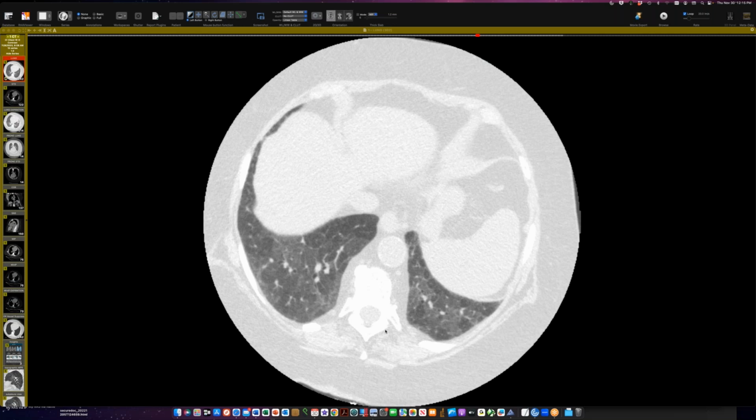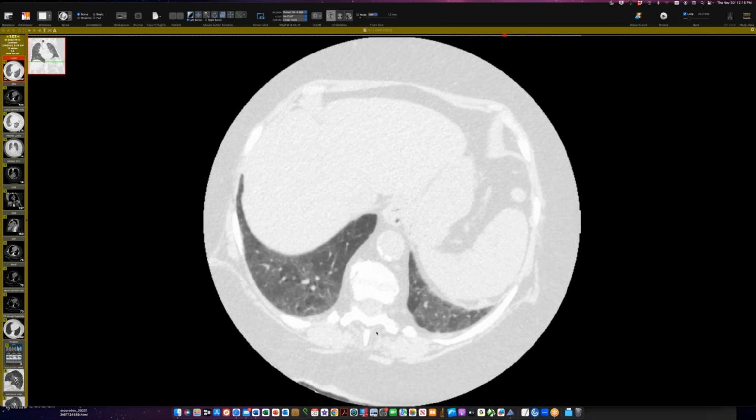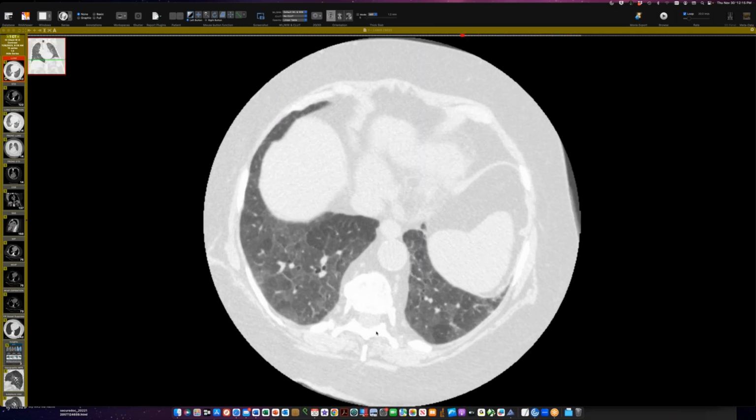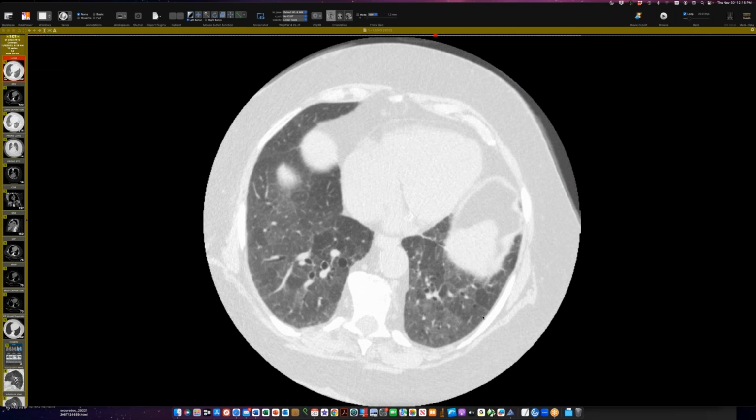You know, patients are allowed to have as many diseases as they want, but the diagnosis so far is Sjogren's, and we don't have lung pathology. So, somewhat ambiguous findings here, but the cysts would fit with either. The mosaic, I think, points me more toward hypersensitivity.